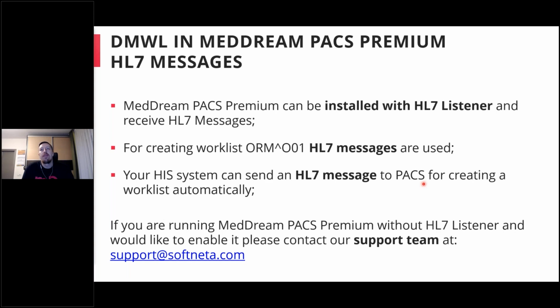And in the HL7 standard, the creation of the worklist messages is always done by ORM messages, or order messages. There are a lot of types of these HL7 messages. They are mostly used for communication between the HIS system and the PACS or different departments by sending patient information, notifications, appointments, and so on.